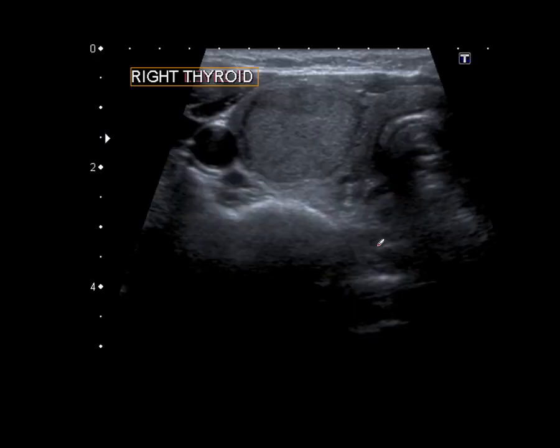Okay, let's just look at a couple of cases. As I mentioned, ultrasound is now the first line investigation we perform for almost any thyroid condition. So when you're interpreting nuclear medicine studies, you really should have some familiarity with this. Here's our trachea, here's our right lobe, nicely labelled, carotid artery. I'm not sure if that's the jugular vein there. I think that's a bit of sternomastoid muscle. And here's the isthmus of the thyroid gland.